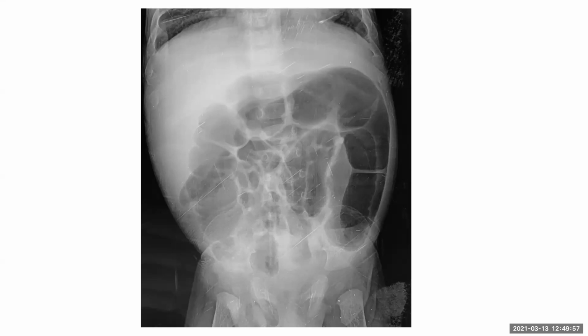Further, if there is a concern for anal atresia, then a lateral projection film can be done, or an ultrasound of the perineal region can be performed to further confirm the findings. On this film, would you choose one of the two differentials that you mentioned? Inguinal hernia leading to upstream bowel obstruction. Okay.